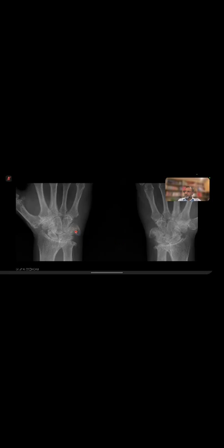Again, same thing, magnified view, prominent erosions. So we do ultrasound, that's how you see erosion. You can see the normal outline of the bone here, and this is the defect on the top. However, there's a normal pit on the top as well, but this is not smooth. That is smooth, at the head and neck junction, but this is irregular because you can see the synovium going into it, and there is some vascularity as well.